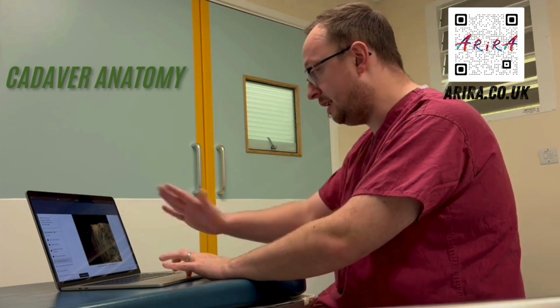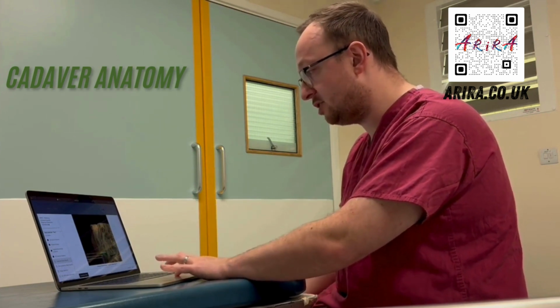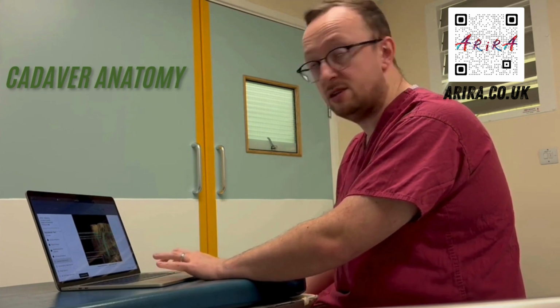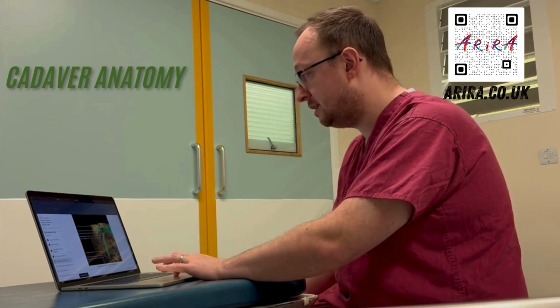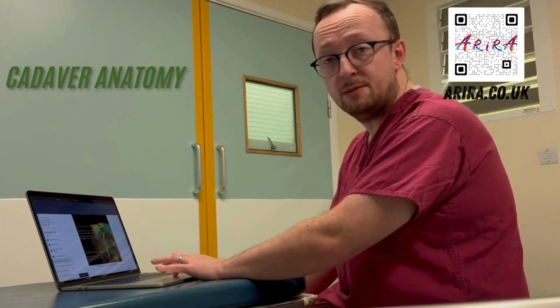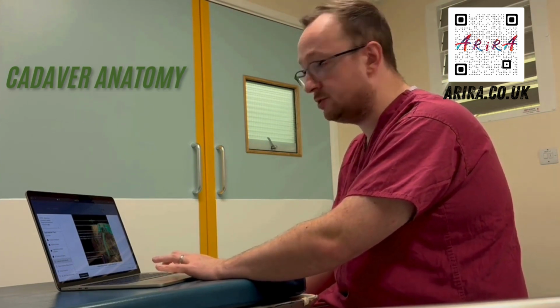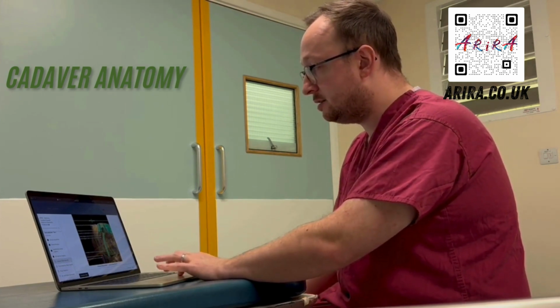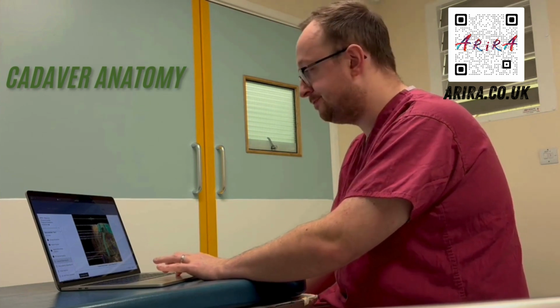So you completely eliminate all the answers and as you slowly raise it up, you'll see it starts labelling, which is good. It's a nice little revision aid as well. Something that I'm not really seeing on many other regional technique manuals or books.